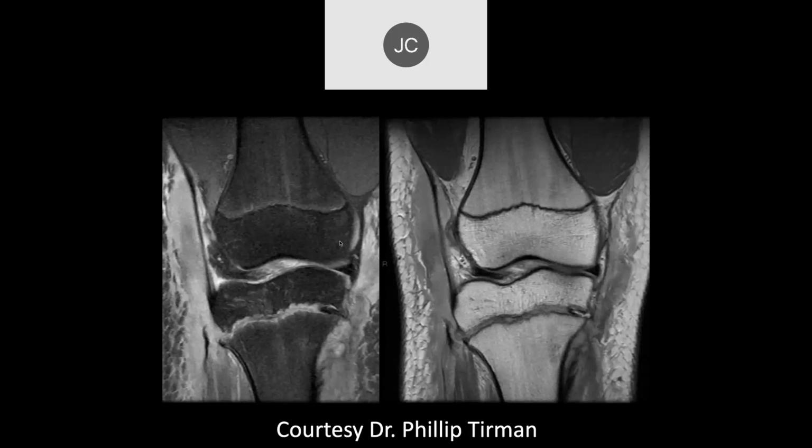It looks like there's a structure that's gone into the growth plate. Maybe the periosteum is torn over here. Yeah. Looks like the growth plate is thickened.